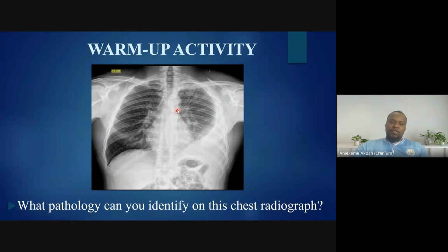If we go to the cardiac and circulation, we look at the heart, and subjectively, without any measurements, you can see that this heart is not really enlarged. If we go to the diaphragms, we can see that, of course, the right hemidiaphragm appears normal and is dome shaped as it should. But when we go to the left, the diaphragm is somewhat obliterated. You cannot really visualize it.